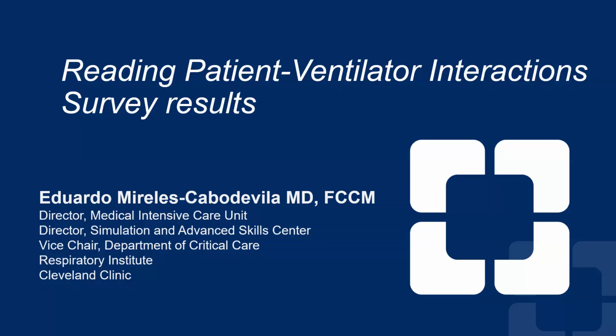I will be guiding this discussion today on reading the patient-ventilator interactions. This is a survey that was sent out through social media throughout the world, for people working a lot on trying to standardize and organize how we speak to each other so that we describe exactly what we're seeing.